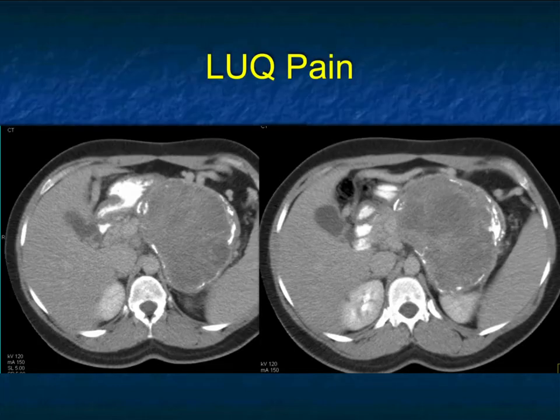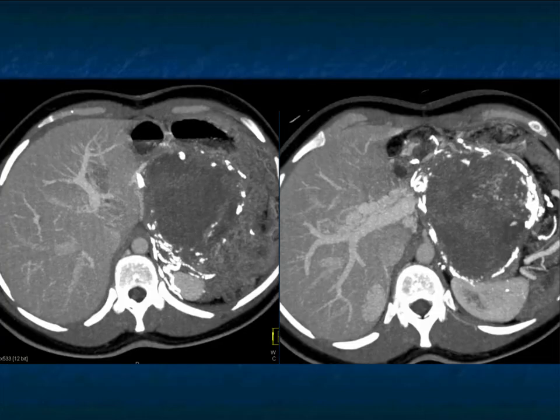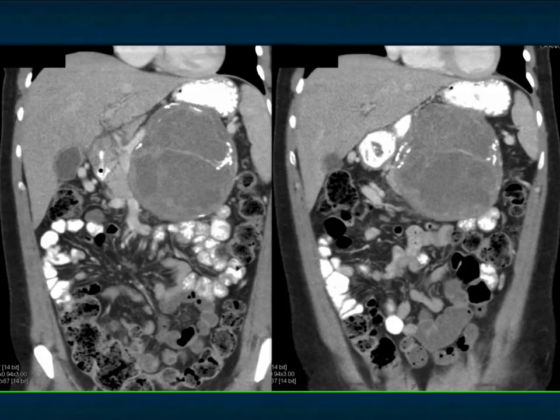Or this one, again, peripheral enhancement. Could it be an old hematoma, pseudocyst? Can it be a neuroendocrine tumor? They calcify all sorts of ways. We talk about MCN with rim-like calcification. And here, when you look at the coarse calcification, some higher density within the lesion, gives you the feeling that this lesion must have bled at some point, and maybe that was the reason for presentation. When you look at the MIP imaging, you really appreciate the coarse calcification.